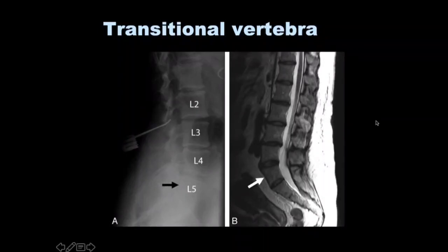How can we comment on exiting and transiting nerves? The exiting nerves are the ones which come out at the level of the neural foramina and anything beyond that. The traversing nerves are at the level of the disc higher up, so one vertebral body above, and that's where the traversing nerve is coming at. So you look at the axial as well as the sagittal imaging. When we are reporting our scans, we put the scan lines on the image.